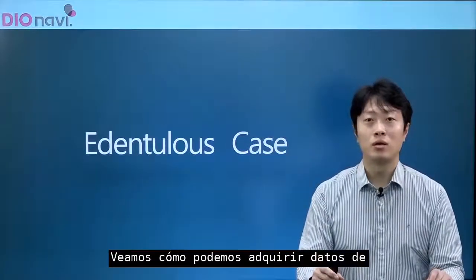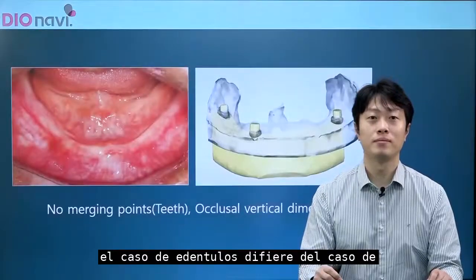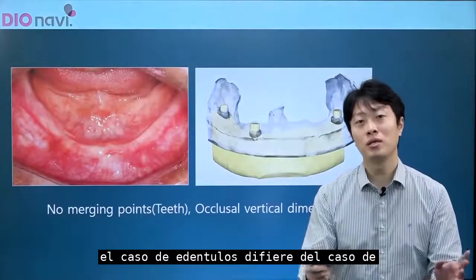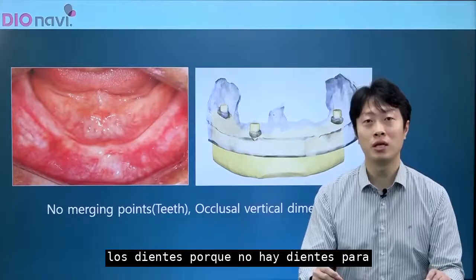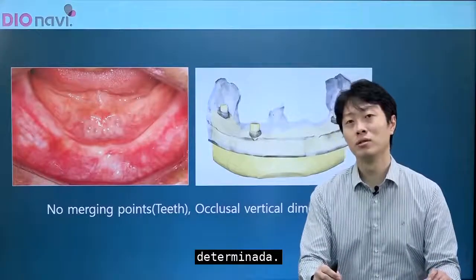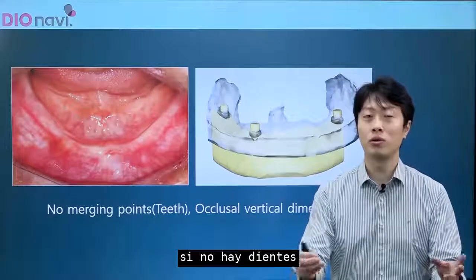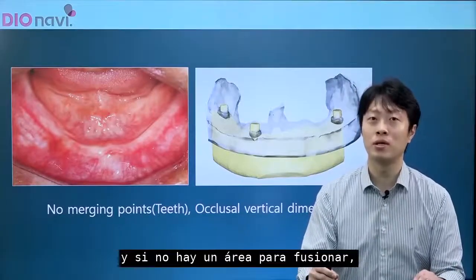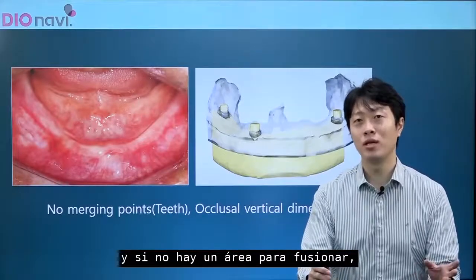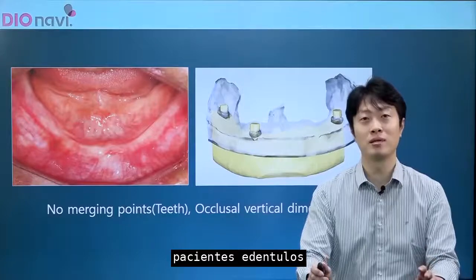Let's see how we can acquire data from edentulous jaw cases. The case of edentulous jaws differs from the case with the teeth because there are no teeth to merge and the vertical height is not determined. You may wonder how merging is done if there are no teeth and if there is no area to merge. Let's take a look at the process applied to edentulous jaws.